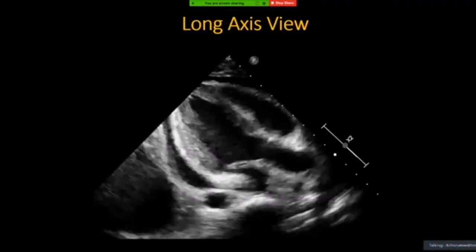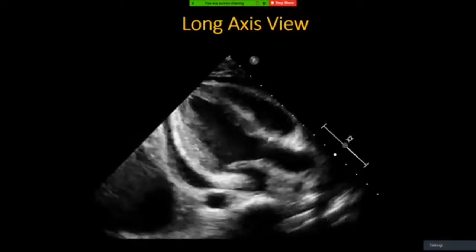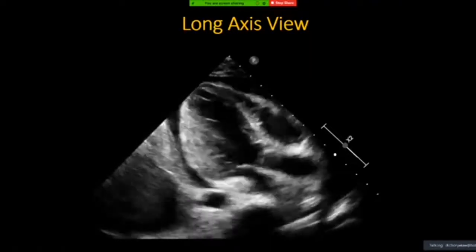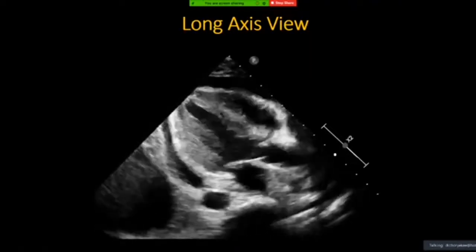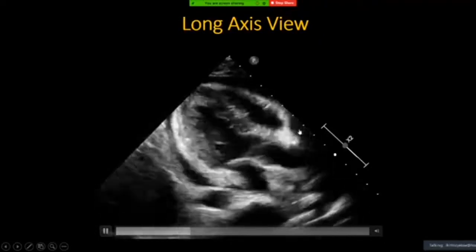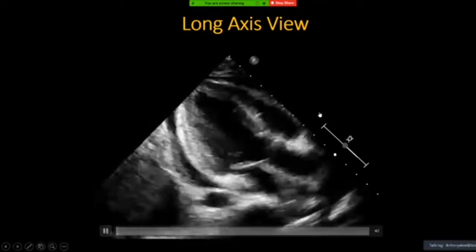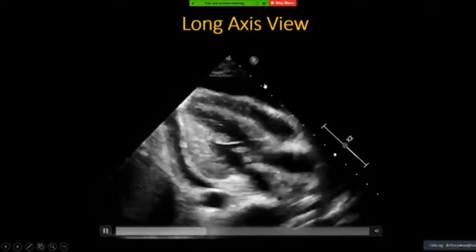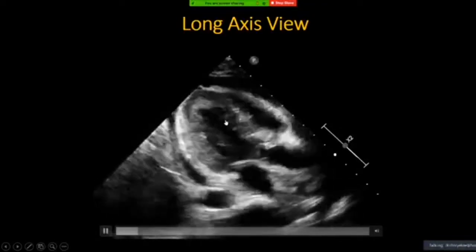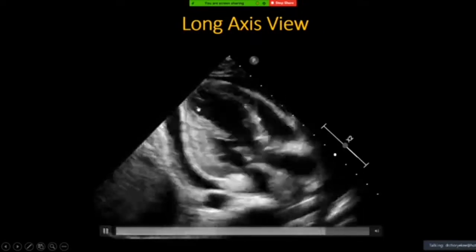So can I know what type of view it is? Pericardial effusion. Yes, so this is a pericardial effusion, right? There's one important thing you can point out here: when you look at the echocardiogram, the very marked structure is the pericardial effusion. But we also don't forget to look into the chambers, and go quite systematically. We could see that this is a parasternal long axis view, right?